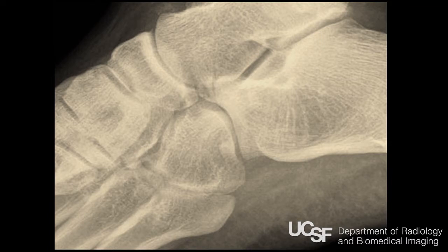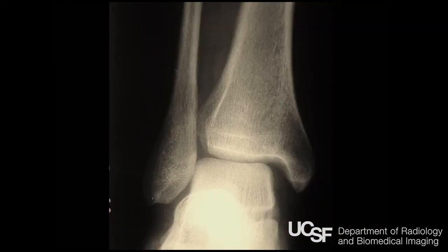Another common fracture that is commonly missed, you should look at this place on every single ankle radiograph, right here. The anterior process of the calcaneus, where the bifurcate ligament attaches, is often broken with the same mechanism as an ankle sprain. This is a commonly missed fracture. Make a specific effort to look for it.